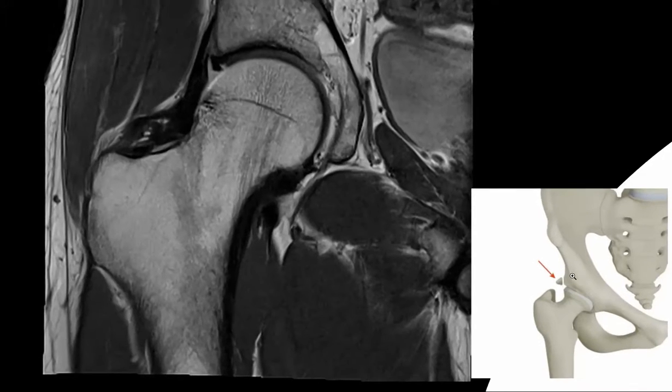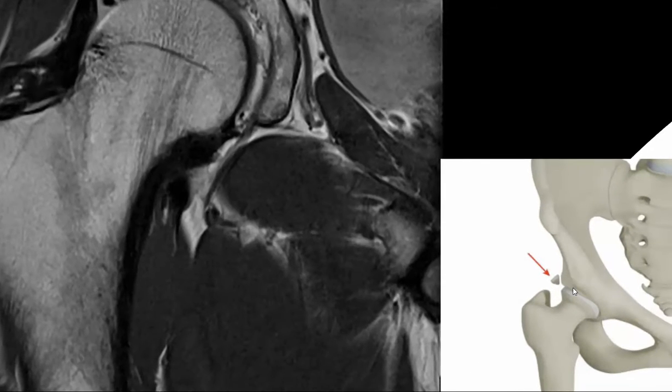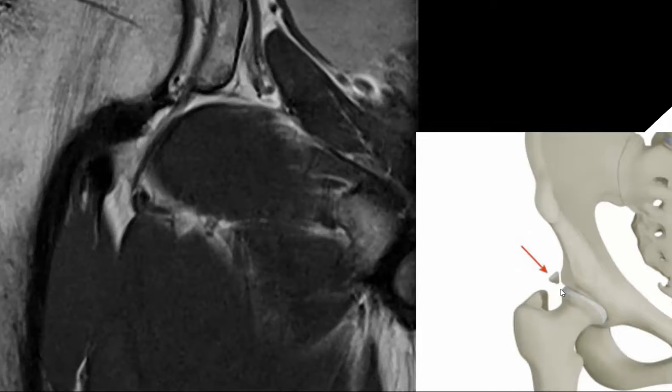The other thing I would like to bring your attention to are ossific fragments adjacent to the acetabular rim. These are known as os acetabulae. Their clinical significance is unclear, but we see them very often. They are present in approximately 2 to 3% of asymptomatic patients. You will see them on X-rays more than you'll see them on an MRI scan. We think they may represent ununited secondary acetabular ossification centres, possibly incompletely healed acetabular fractures, fragmented osteophytes, or labral ossification caused by prior or repeated acetabular trauma. A relevant history is important.